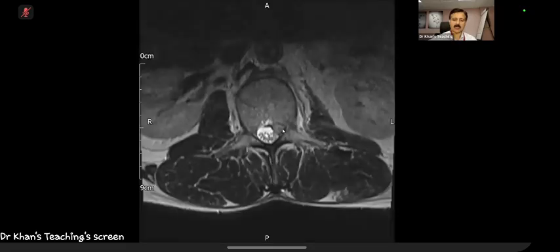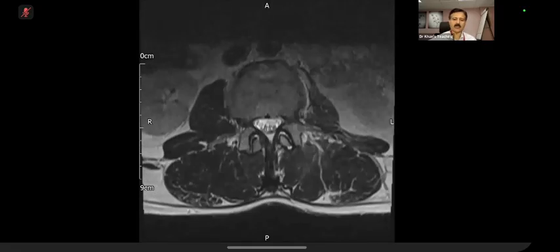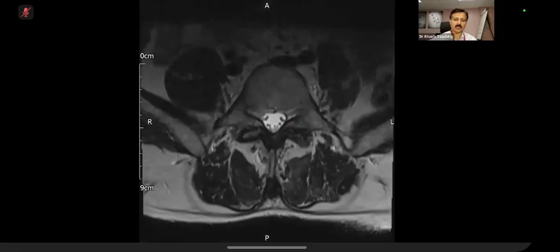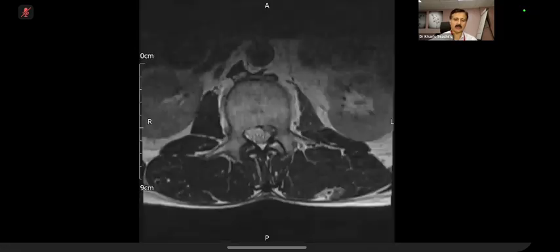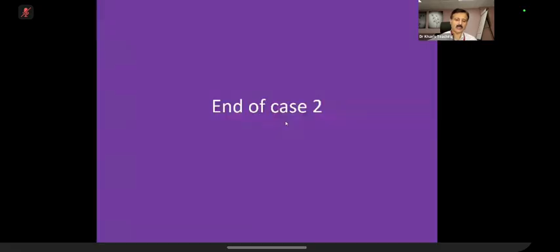Now, this is the pedicle, and you can see the lateral recess, which is compressed. So the examiner is going to ask you which level. If this is the L3 pedicle, it will be the L3 nerve root, which goes below this. So that's a Viva question. This was a sequestrated disc fragment, which is also visible here on a T1 weighted sequence.